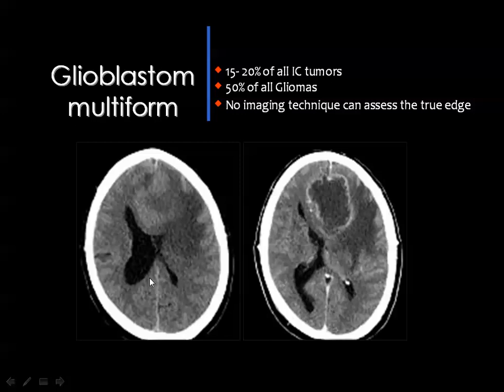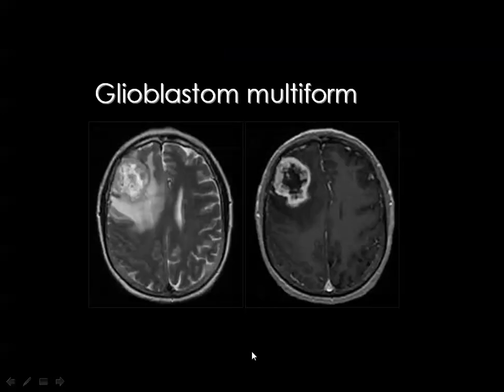And this is the CT scan before and after contrast injection, and you see a tumor which is marginally enhancing. And this is one of the criteria of glioblastoma multiforme: marginal enhancement, but the enhancing margin should be of non-uniform thickness in order to differentiate this from the abscess. And we have many other ways to differentiate glioblastoma multiforme from an abscess. Glioblastoma multiforme, being an aggressive tumor, is surrounded by significant perifocal brain edema and exerts a significant mass effect.